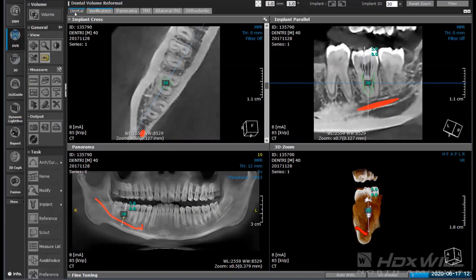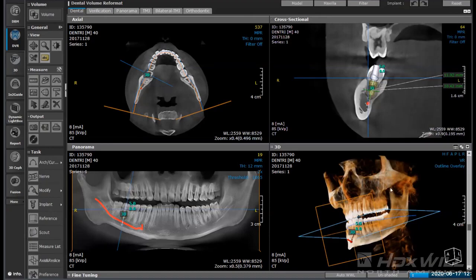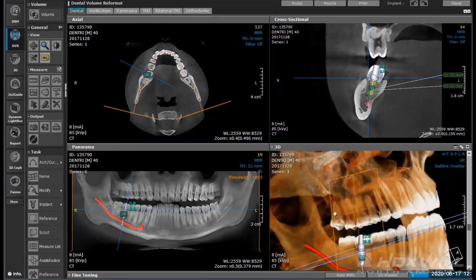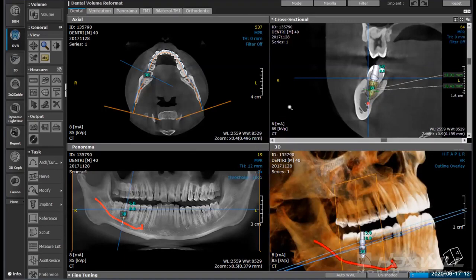So as we go back to dental, again, in that cross section, we see the bone, we see the abutment, we see everything in place. And again, on the 3D model, same thing, we see that in place, but again, we don't have a soft tissue interaction. So one of the things that on-demand software allows us to do is add an STL into place.